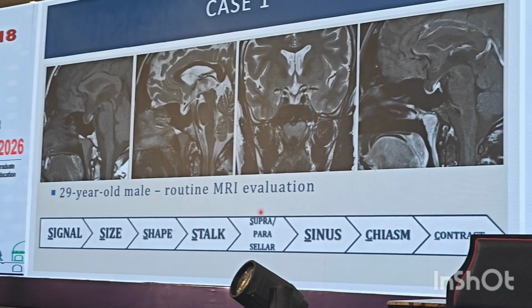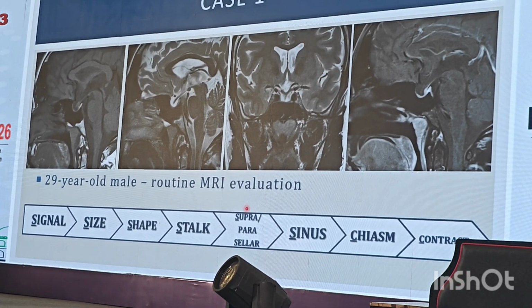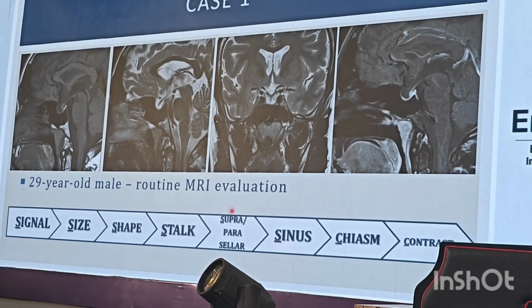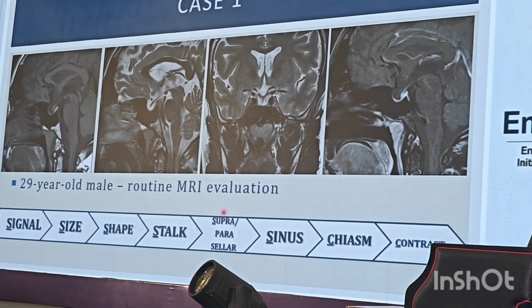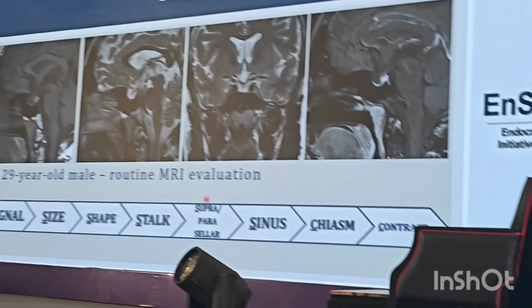So yeah, we would like to start with the audience participation. This is the first case, and this is the only case for which I have a history, because all cases which are referred to me don't have history. I blame the clinicians for this. Okay, so can anyone take it up?